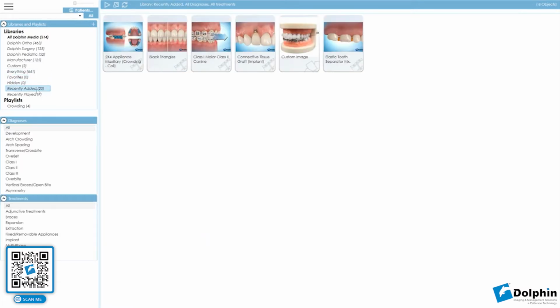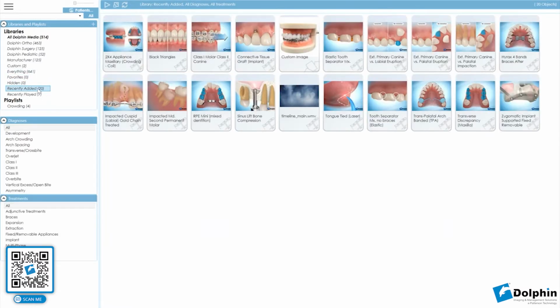And what's nice too is, as I mentioned, every 90 days we do upload new content to Aquarium automatically. So if you do want to see what's been recently added to our product, you can simply click on recently added and see that new content as well.